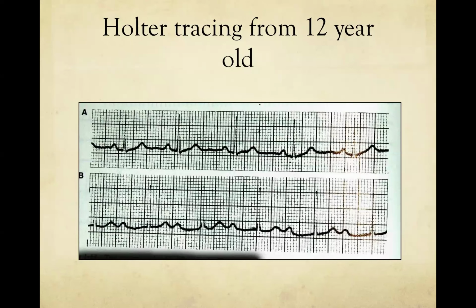So here we have a Holter tracing from a 12-year-old, and why don't we ask Dr. Mukhopadhyay what you think is going on here? Good morning, Dr. Paz. Good morning to you.